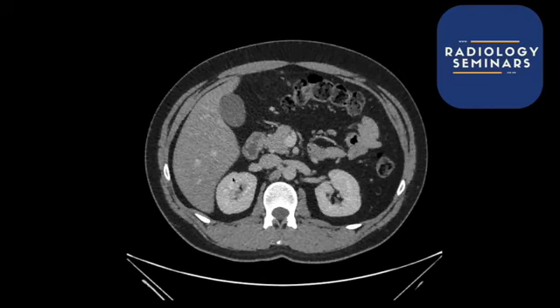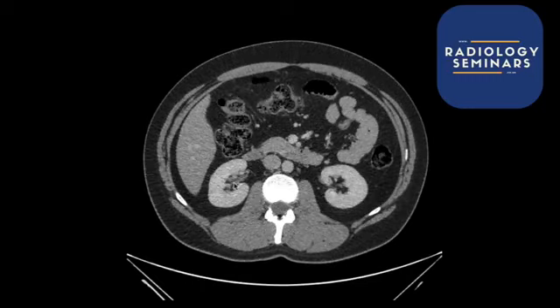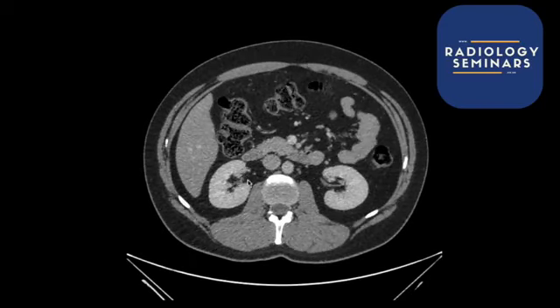Below those adrenals, you've got these structures sitting here. I did allude to them earlier; for those of you coming a little bit late, no worries, you can hopefully watch the recording afterwards. These are the kidneys, and you've got the medulla and the calyces sitting here as well. If you've got obstruction, this will look very blown up. These areas will look like Mickey Mouse gloves, literally like a Mickey Mouse hand, and that would be indicative of obstruction.